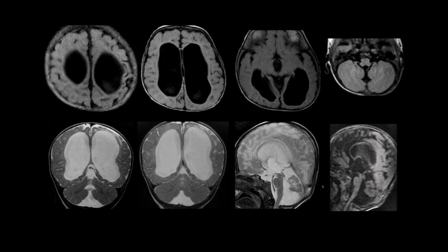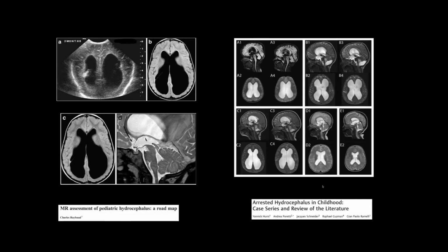So what is your final diagnosis or suggestion? No, we don't know. There is no obvious major malformation of cortical development, but because of the cerebellar hypoplasia, atrophy, and vermis signal changes, one thought was congenital muscular dystrophy, because this child also has early contractures on one side.